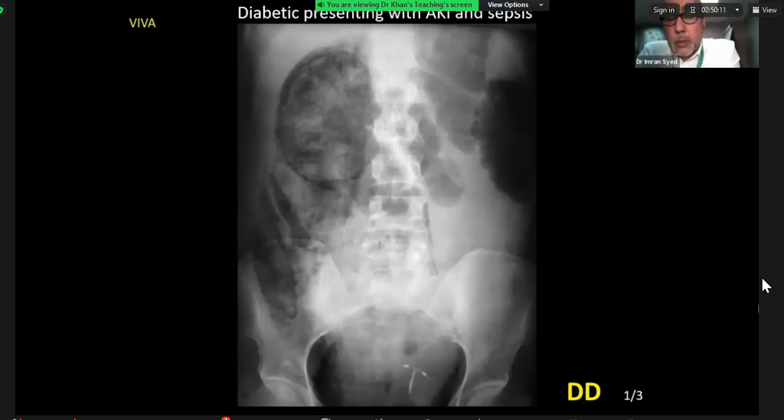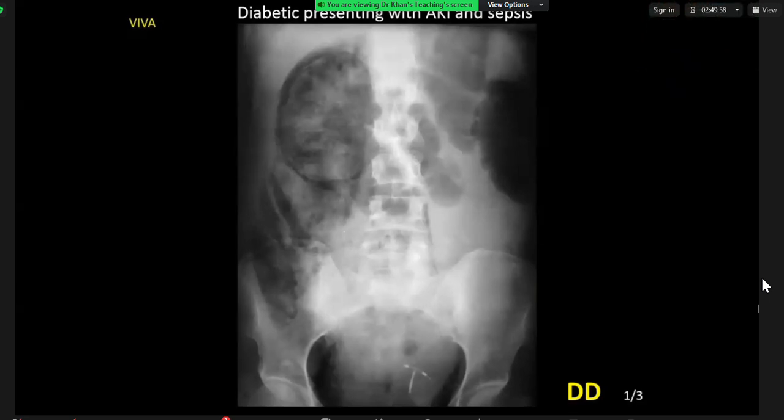Okay, so when you talk about the retroperitoneal gas, where is that gas seen to be tracking? Can you see any tracking here, or are you happy that it's confined to the perirenal space? It appears to be tracking inferiorly, so towards the right lower quadrant, and in front of the pelvis. This may represent some overlying bowel loops, but I can see mottled gas at the level of L4 and L5, which is in continuation with the kidney as well.